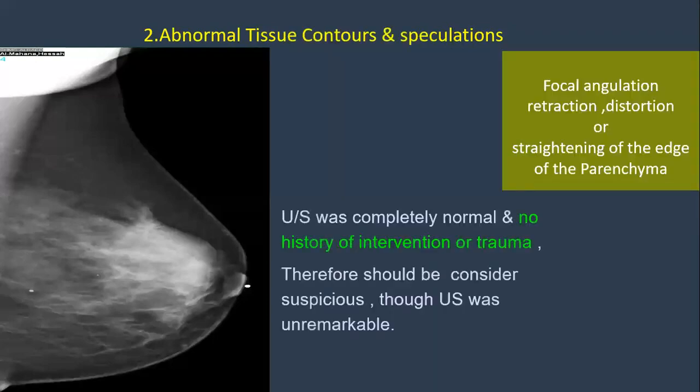A long time ago, I don't remember exactly, but this one I remember had no ultrasound correlate, but I reported it as suspicious. I don't remember that I could find feedback on the result. Long time ago. And what about this one?